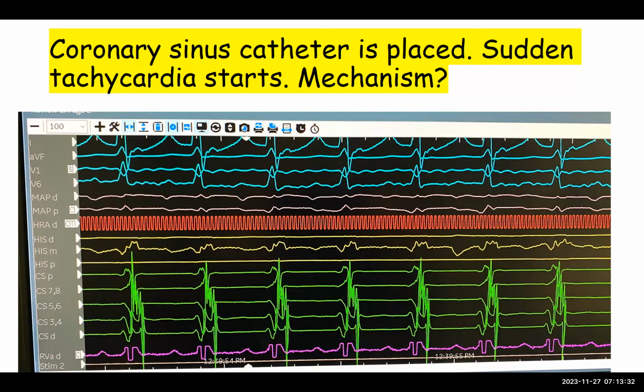I don't believe that's the case. Okay. It's usually timing, right? It's the number of milliseconds after the last sinus beat, and the refractory periods of the pathways that determine that. So yes, we've agreed that this was a PAC that induced this.